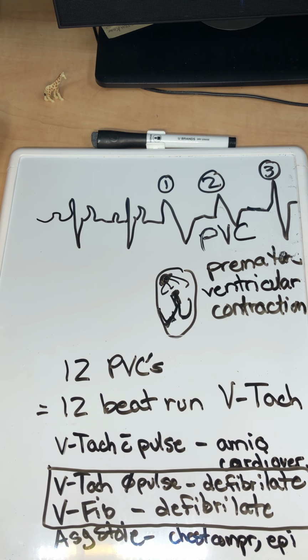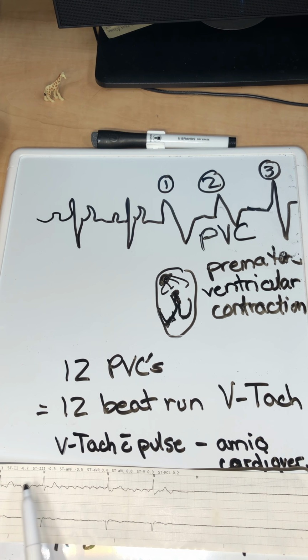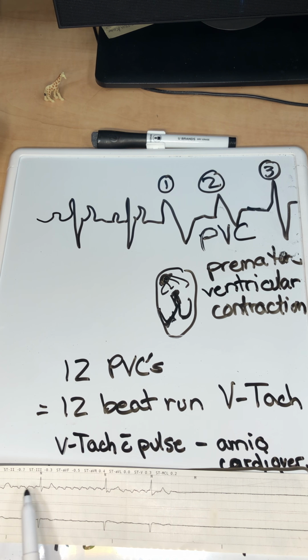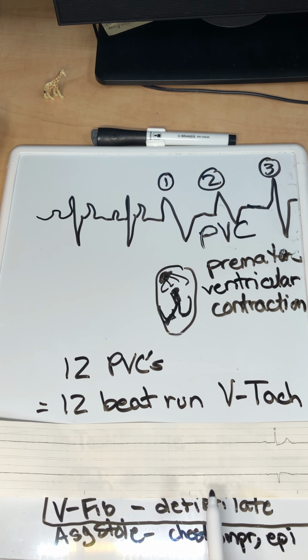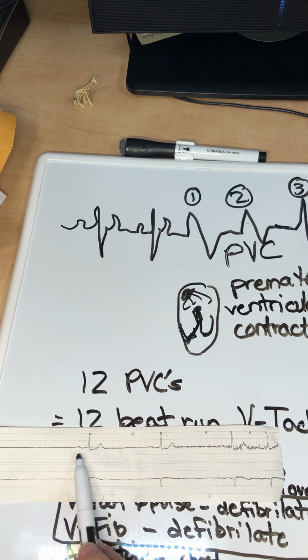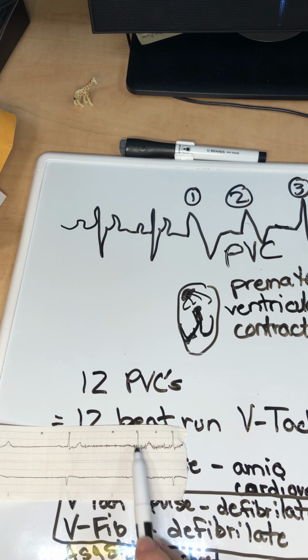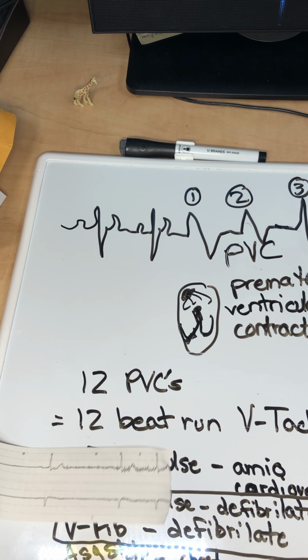Oh, look at this. You have a beautiful, what is this? What are these waves here? Do you see here how it's kind of sharp looking? Those aren't P waves, those are F waves. This is atrial flutter. So the patient is here in A flutter, and look what happened. They went into asystole. Ooh. And then they came back. The SA node kicked in again. Look at that P wave there. The SA node kicked in here, and all of this here is just movement, people running in and checking to see, are you okay? Are you okay? So that's good.